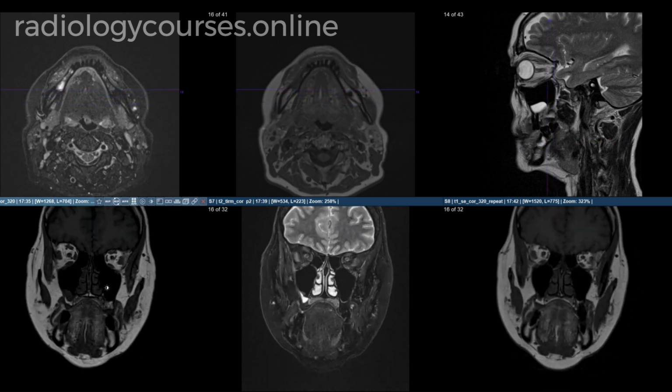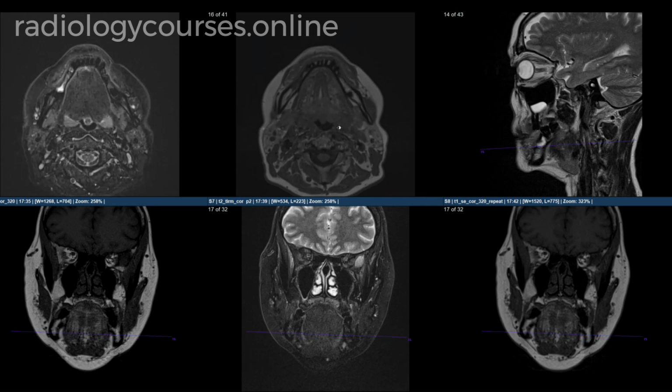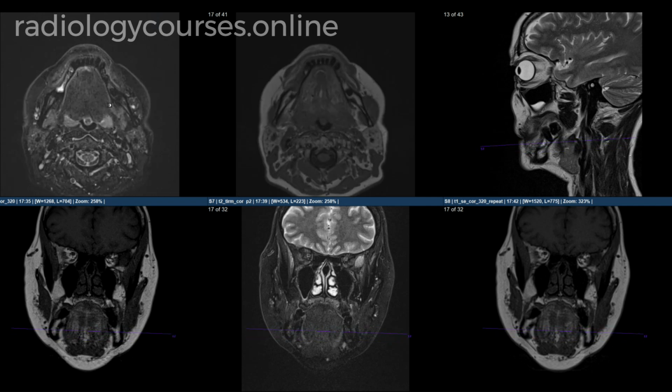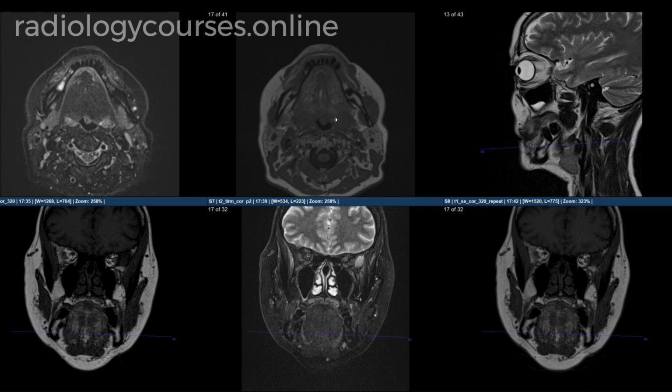Given the history that the patient is on bisphosphonates, features are most likely to represent avascular necrosis or osteonecrosis of the mandible. Differential would include osteomyelitis, especially chronic osteomyelitis, if there is a history of any dental infection or recent dental removal with acute or subacute onset of the swelling. Without that history, features are fairly characteristic for osteonecrosis of the mandible.